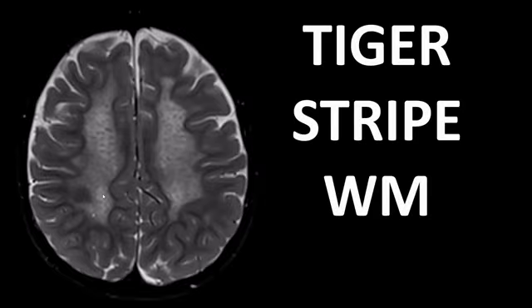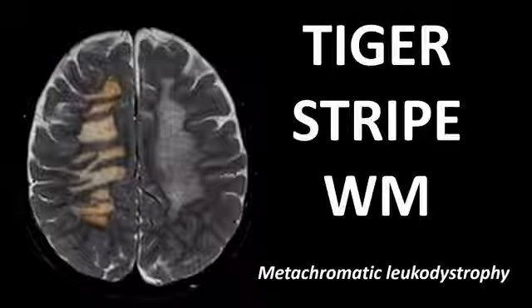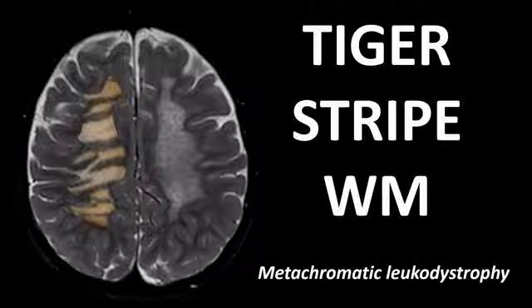Now, the next one has two names, I believe. We have the tiger stripe sign. This is a patient with an inborn error of metabolism leading to leukoencephalopathy or a leukodystrophy. We see abnormal white matter. It's symmetrically abnormal in both cerebral hemispheres. And if you see all these small hypointense stripes, this tiger stripe white matter pattern is typically associated with a genetic disorder called metachromatic leukodystrophy.